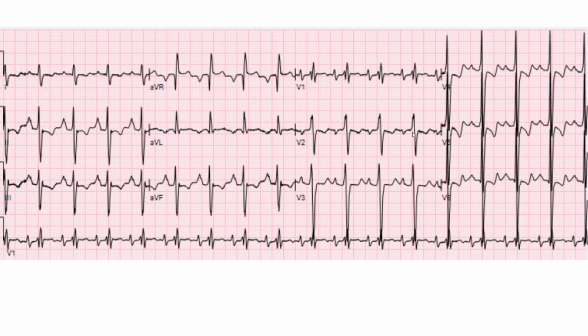So this is the final diagnosis. You have sinus rhythm, biatrial enlargement, right bundle branch block with a fractured RS, R prime, S prime pattern suggestive of myocardial disease, severe LVH voltage, but also RVH based on the unusual axis accompanying that LVH, whether you have right axis or northwest axis, that will be suggestive of RVH in conjunction with LVH. Also the Katz-Wachtel sign, that tall biphasic QRS in V4, V5, V6.